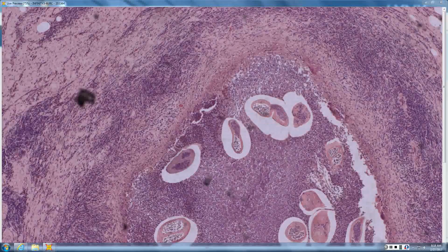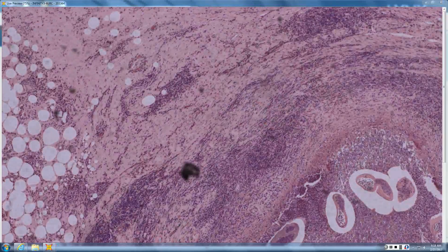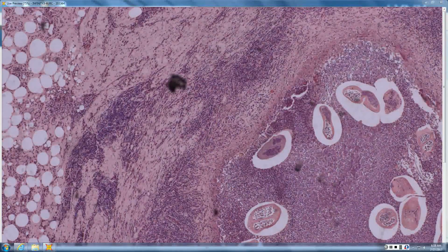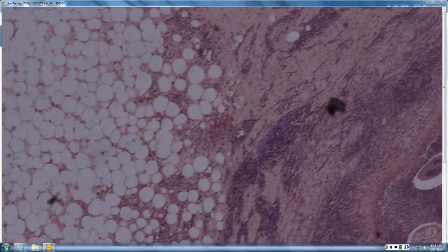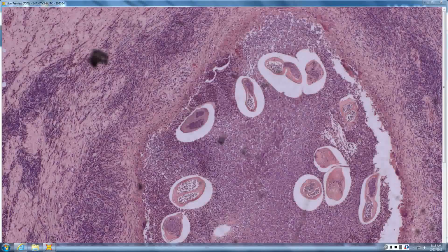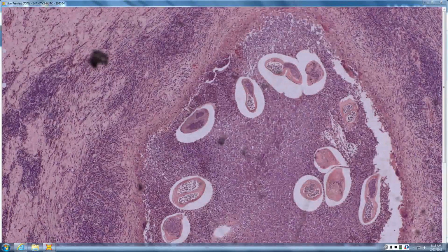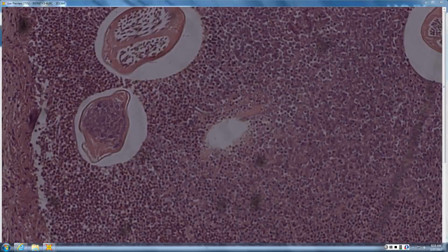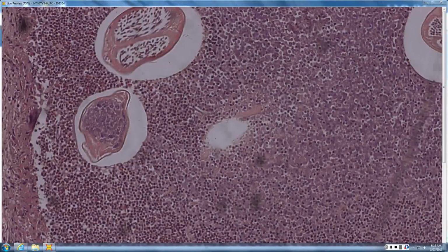Is this the bifid uterus? So there's a bifid uterus. It's a gravid worm. Come on, Shane got this in like 2 seconds. He looked at it and said it. It's not Dirofilaria. The muscle's too thick. It's Onchocercoma. So does onchocerciasis get a rip-roaring immune response like that?